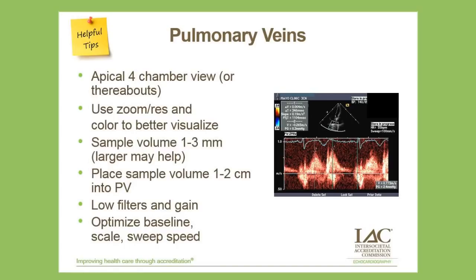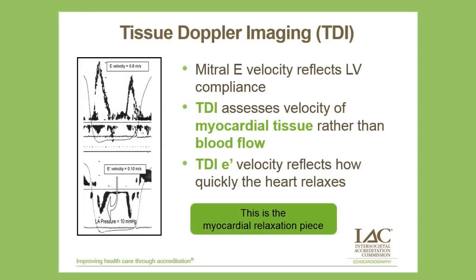And I'm going to get on my soapbox for just a moment. It doesn't help anybody if you are acquiring any kind of Doppler signal and you're only using this much of the screen. So use your screen real estate. It will help you with your measurements.